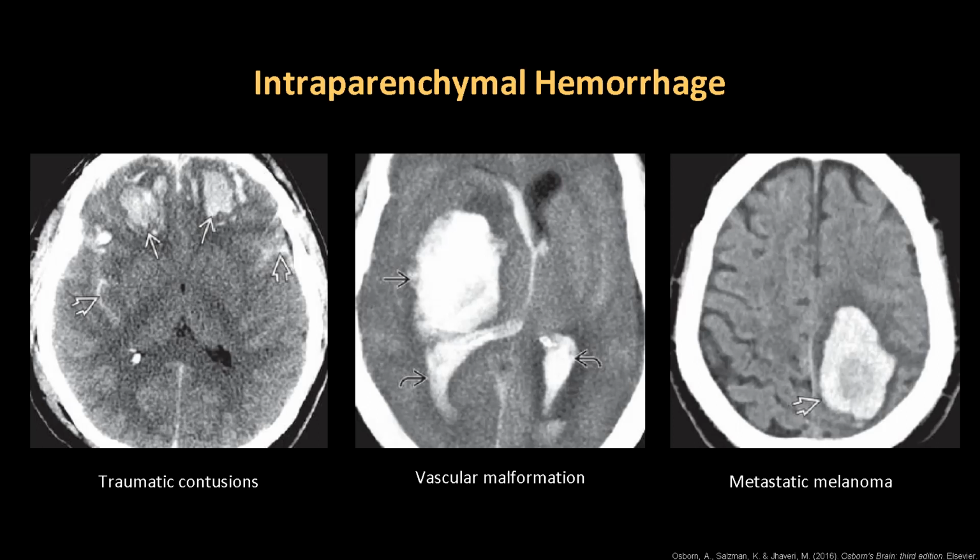That's the extra-axial hemorrhage, but as I said, we need to scan the intra-axial brain tissue for hemorrhage as well. And these are some not subtle at all, very large examples, but you'll have traumatic contusions here on this side of the slide with some subarachnoid hemorrhage likely here as well. But big hyperdense regions representing acute blood within the brain tissue. It's not extra-axial or outside the brain tissue along the convexity. And often a good way of helping decide if it's intra-axial, aside from brain fully surrounding the whole thing, is they tend to cause more vasogenic edema or hypoattenuation directly adjacent to the bleed itself in the brain tissue.